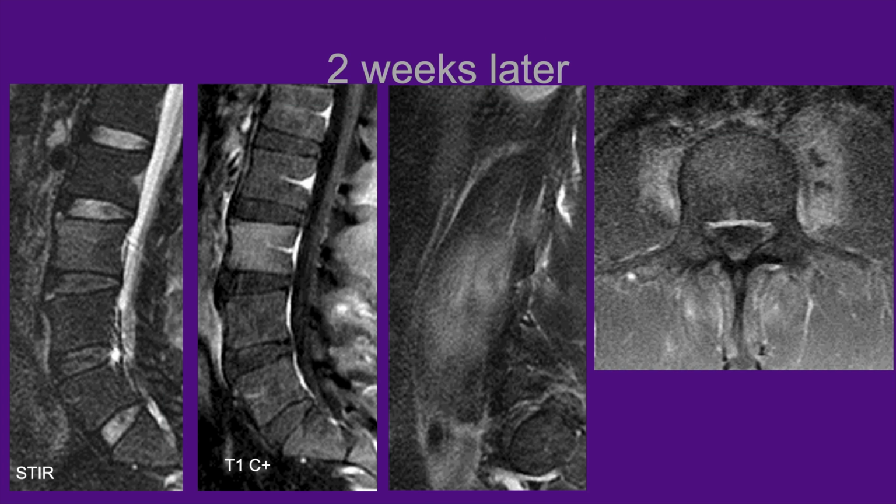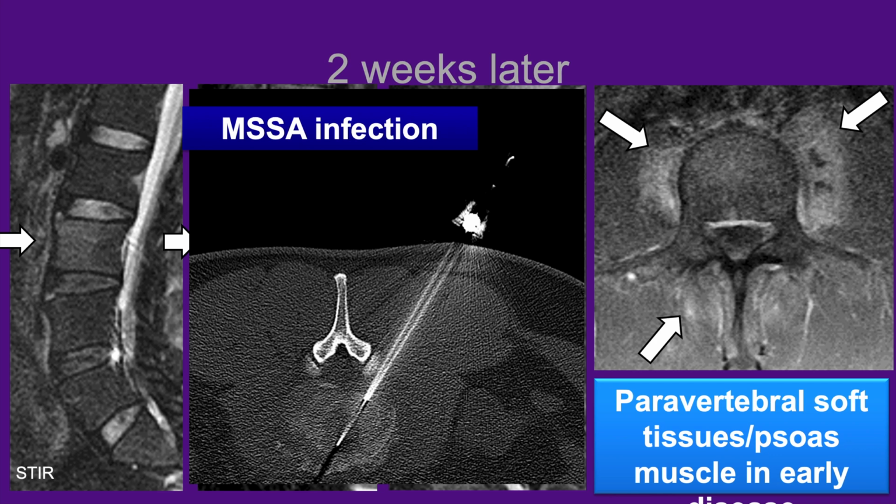Patient came back subsequently and now has early changes of osteomyelitis in the vertebral body with increasing findings in the paraspinal soft tissues, and this was felt to be osteomyelitis, which was biopsy proven.